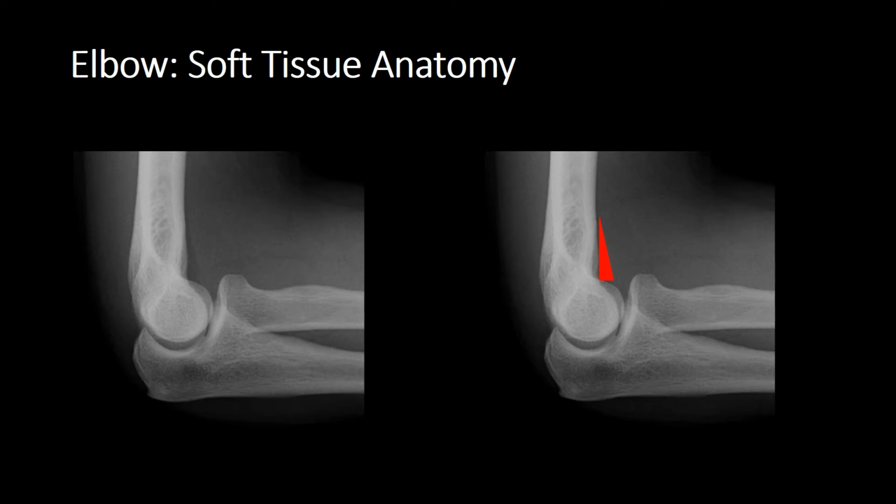Now, just a word of warning, if the patient is imaged with their elbow in extension, then the olecranon process slots inside the olecranon fossa, which will cause the posterior fat pad to displace. So the posterior fat pad is visualised if the arm is in extension. However, it is not visualised on the lateral view, and that's really important.